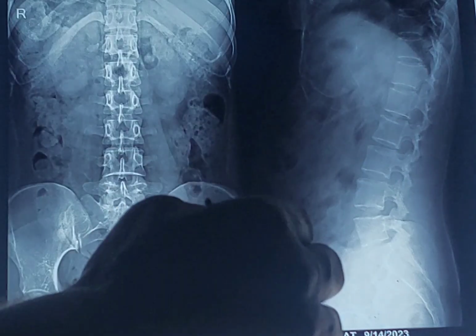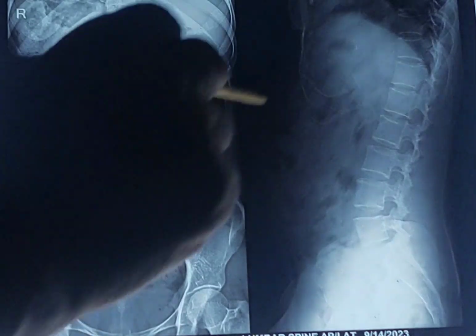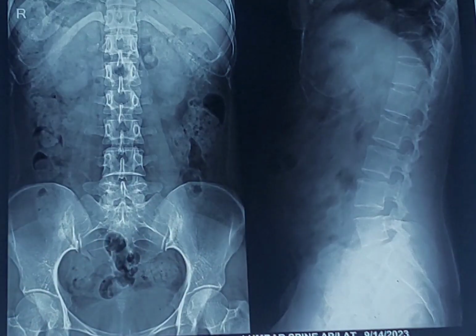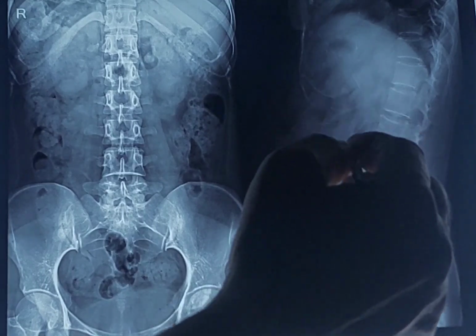In the vertebral column, which consists of the series of all vertebra and the intervertebral discs, how much of the vertebral column is contributed by the intervertebral disc? And the answer is, about 1/4 to 1/5 of the total length of the vertebral column is contributed by the intervertebral disc. And here you can see the curvature.